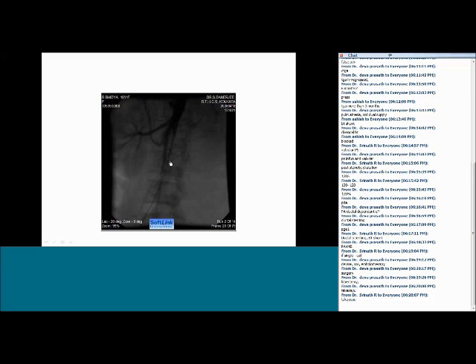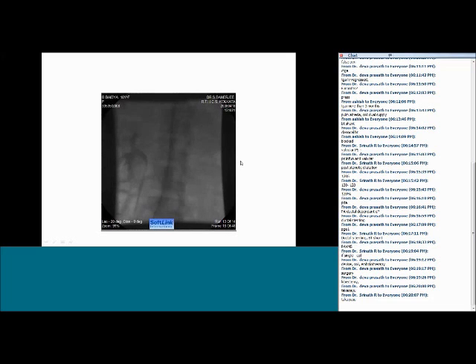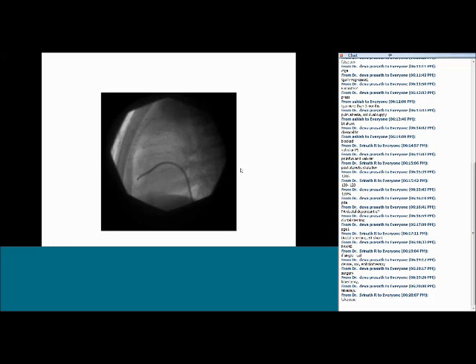That was not done. This narrowing of the descending aorta was stented, and gradually the left ventricle function improved, and the MR also came down significantly. So she did not need a mitral valve replacement at the end of the day. So that's nice flow to the descending aorta post stenting.